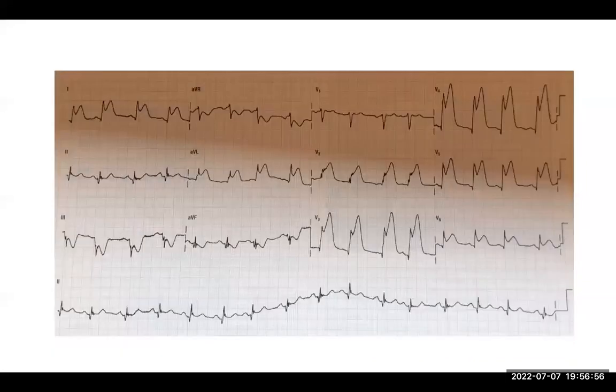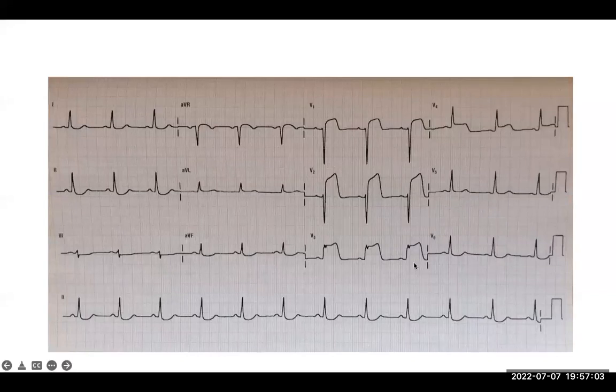So in the subsequent ECGs, because we are finished with ACS and ischemia, I'll just give you examples. This is very clear. What can you see here? We have got ST segment elevations in V1, V2, V3, all the way to V4. This is a very massive, we call it massive anterior ST segment elevation acute coronary syndrome. And when you categorize, anterior STEMIs are very bad. This kind of patient, we usually keep them in ICU for 3-4 days because LAD, as you know, supplies a large part of the left ventricle.